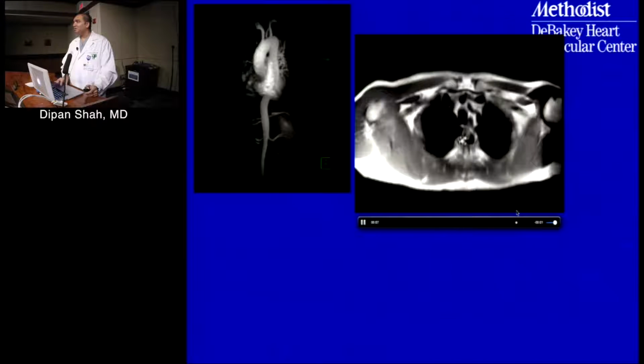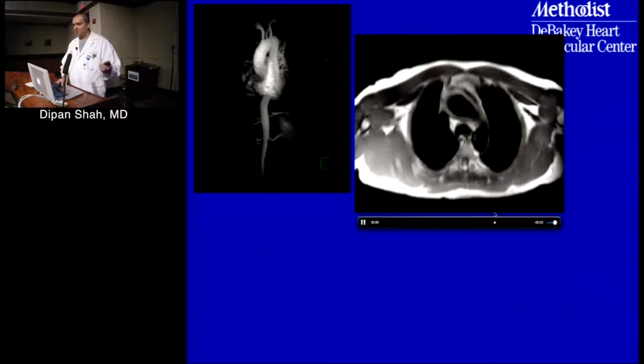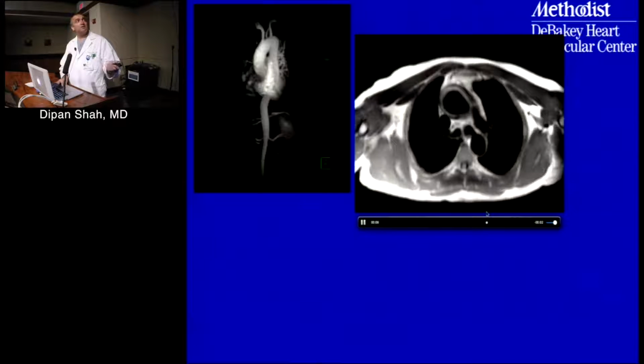Or nothing of interest? Okay, so you're absolutely right. The one is the wall looks thick, right? Now the issue with this dark blood technique, remember, is slow flow could also give you kind of a partial signal void as well, right?